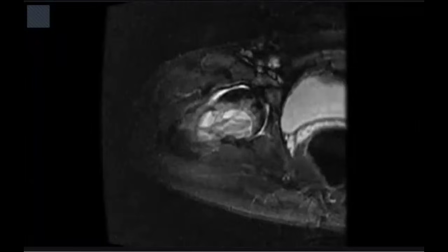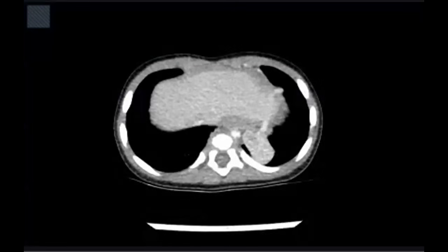So it was a case of Mazabraud syndrome with secondary aneurysmal bone cyst. This patient should be discussed in orthopedic MDT for possibility of excision of aneurysmal bone cyst and bone grafting, and further follow-up on the sites of fibrous dysplasia. Fibrous dysplasia may turn malignant, but very rare, maybe osteosarcoma or fibrosarcoma like this. But I think it is less than 1 to 3% of cases.